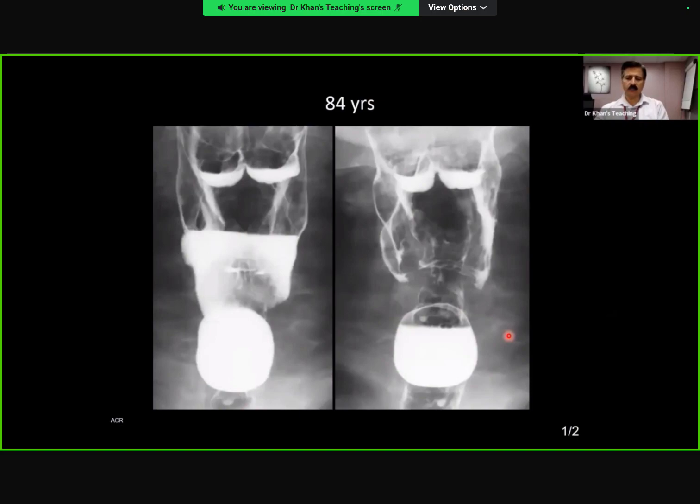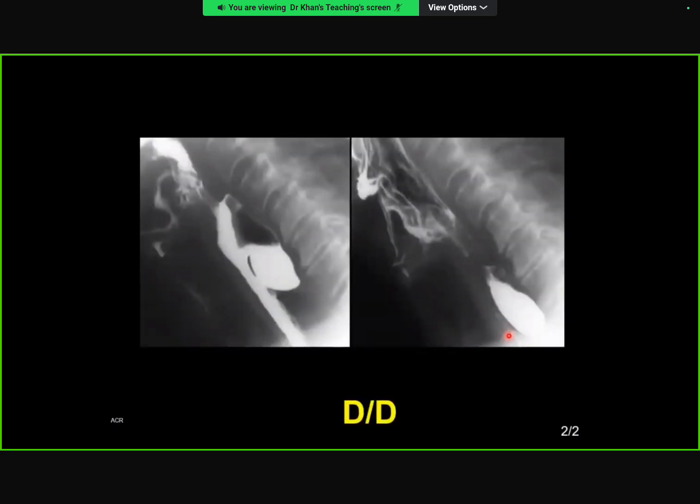Over to candidate 9. So this is a contrast swallow with the coned view of the hypopharynx. There's contrast outlining the vallecula and the piriform sinuses, and then there's this well circumscribed outpouching with the air fluid level in keeping with the pharyngeal pouch. I would have assessed a lateral projection to see whether Excellent. So, confirm? Yeah, Zenker's diverticulum. Okay, I'll take over. Well done.